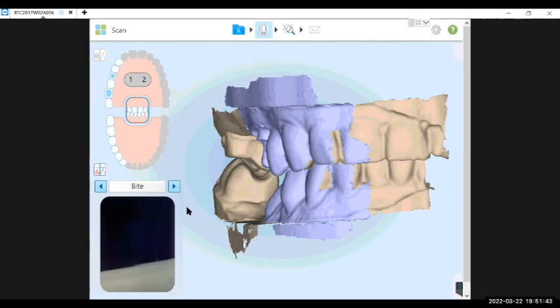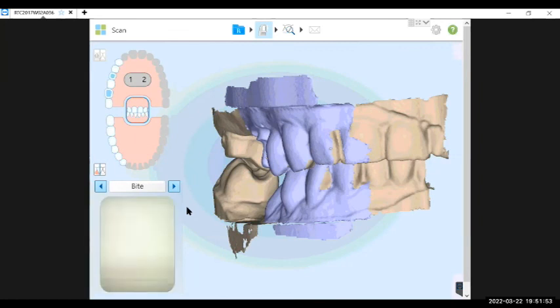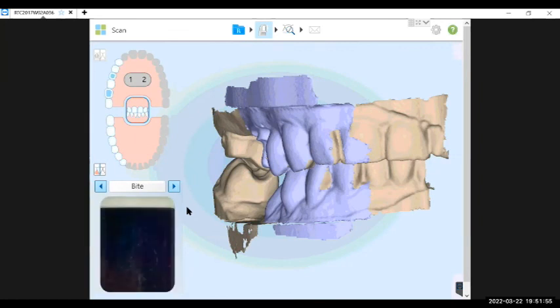I took the scanner sleeve off, and you can see that the lens looks fine. Super great. But if I were to put on a different sleeve and it's scuffy, that could definitely prevent the scanner from collecting data in an efficient, fast manner. It can also cause distortion with the scans. So just something to keep in mind.